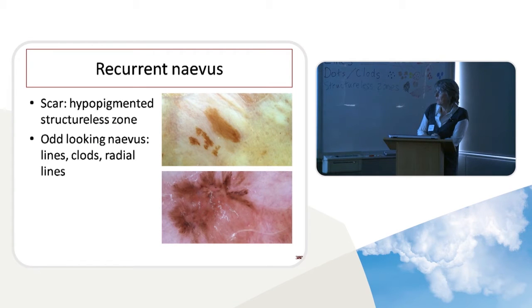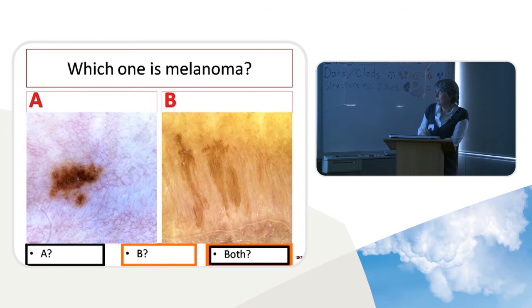We've done recurrent nevus. That's benign nevus, that's melanoma. Remember, the nevus occurs within the scar, the melanoma on the edge of the scar. There's a scar along there, you probably can't even see it. And there's asymmetry of colour and structure and loss of structure. Don't want to talk about Spitz, it's too uncommon.